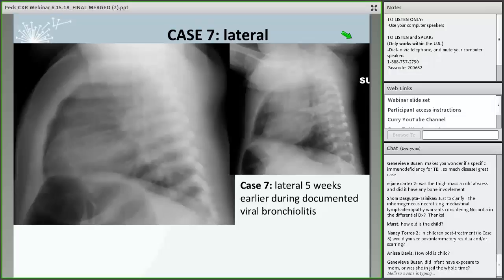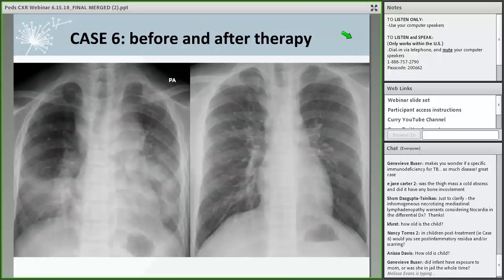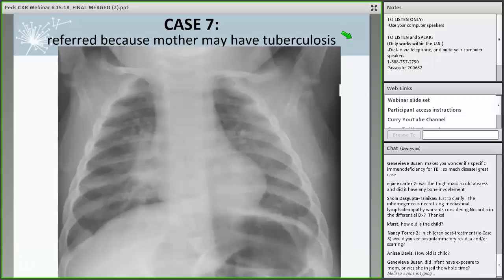All right, Dr. Vu, what do you think about these films? Okay, so let's go back to the frontal chest radiograph. Here it is. It is great. All right, okay. So I think I'll let you guys move the films. Yeah, no problem. Okay, so again, you can see that the upper mediastinum is fairly prominent, but this is okay for a patient this age.